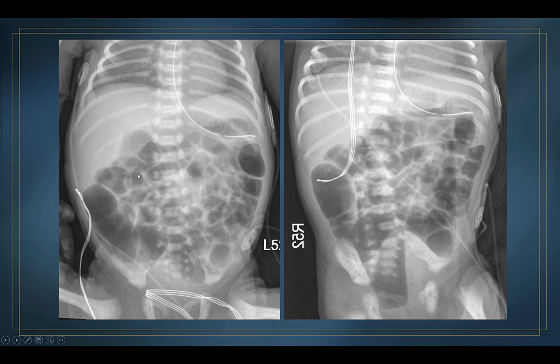Another patient, same thing. It's like, what is this asymmetrically dilated loop of bowel seen lengthwise in the right lower quadrant? Well, I think the decube pretty much proves this, probably the sigmoid colon. And I'll show you a more dramatic example of that in the next one or two slides. So it shouldn't, and again, there's a fluid level in this rectum.